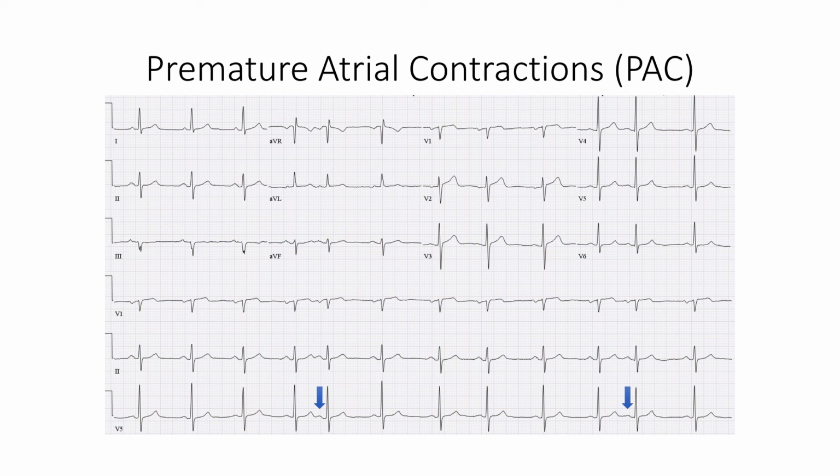This is because an area of atrial tissue became electrically excitable and sent out an early electrical impulse that preempted the sinoatrial impulse for one beat. After this PAC, you can see that there's a short pause, a compensatory pause, before the normal sinoatrial impulse starts the next PQRST complex. We see another example of this on the 11th beat, where again we have an unexpectedly early P wave with a changed shape or morphology, followed by an early QRS.